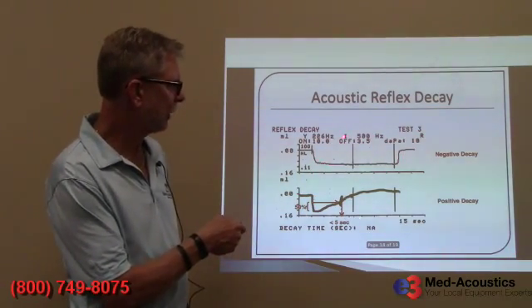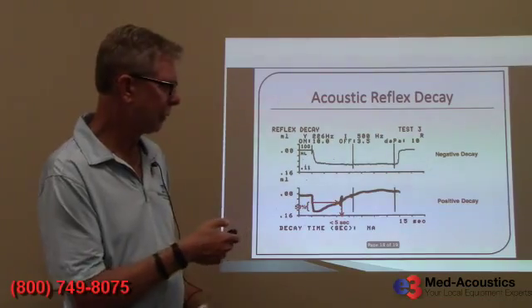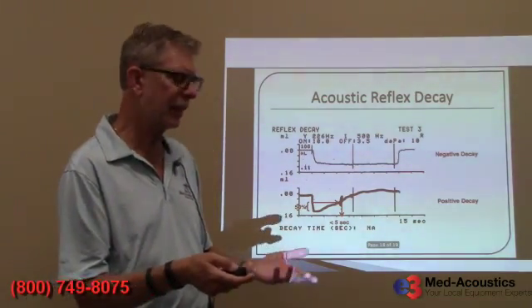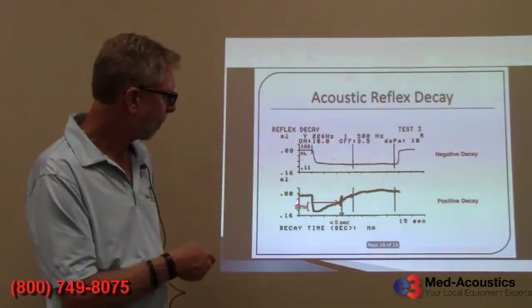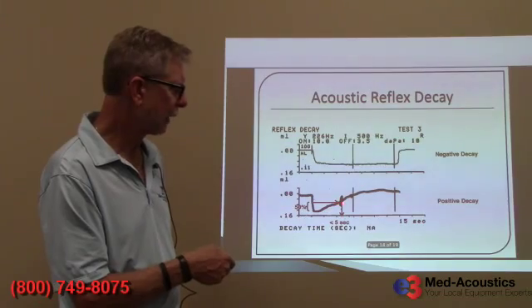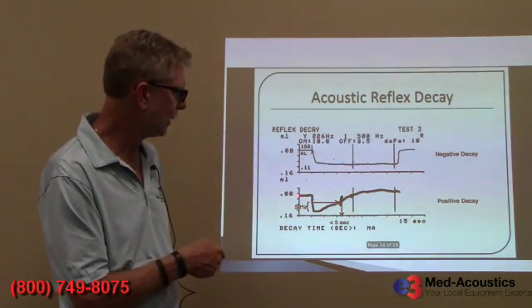And notice this is done ipsilaterally at 500. It can be done contralaterally, and most often is anyway, and usually done at 500 hertz. All right, so here's a case where there is reflex decay. This would be what it looks like.